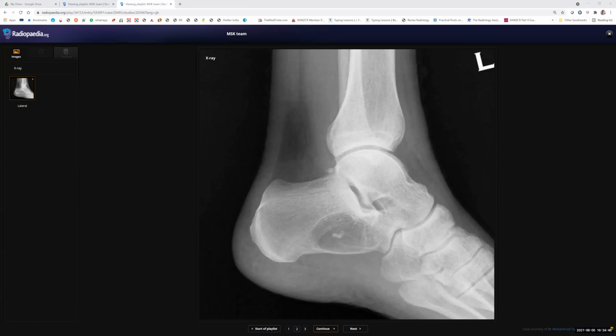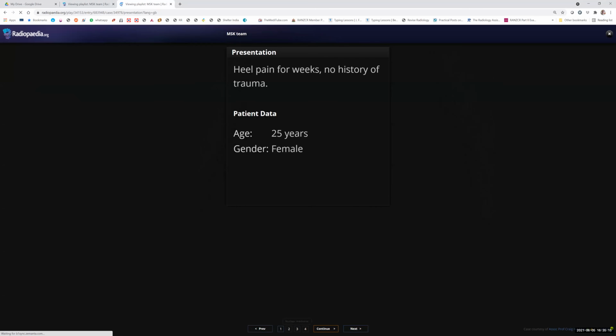I'm given a radiograph of the left ankle of a man who has suffered a fall, in which I can see a lucent lesion in the calcaneum with a speck of calcification inside. There's no periosteal reaction. There's a thin sclerotic border. My differential would be intraosseous lipoma, or the second, I forgot the name, but there are two or three.